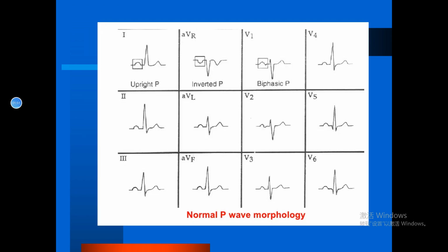So what about the normal P wave? It is very important for us to define whether the P wave comes from the sinus node or not.